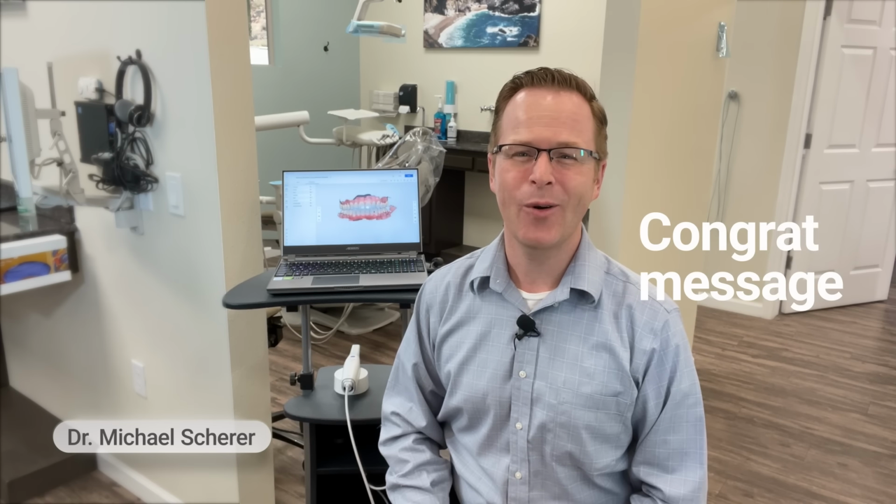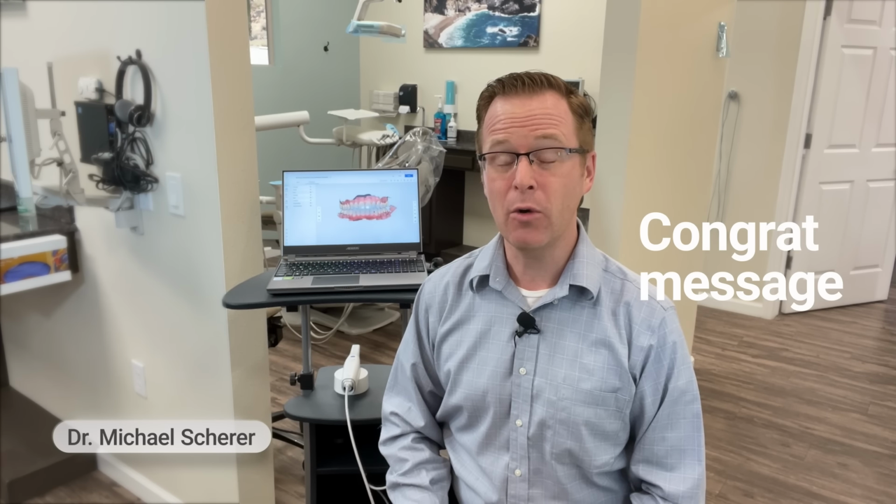I'd like to go ahead and congratulate Team Medit for being able to develop an incredible model building software built directly as an app into my Medit Link software for my Medit i700 scanner. Talk about incredible. This model builder software is native, intuitive, and really streamlined for me as a clinician for being able to make on-the-fly models for my dental practice.